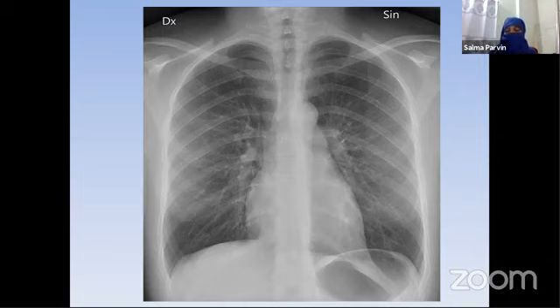But about the hemidiaphragms, I advocate that you should go from the posterior ends of the ribs, because from the lateral view in humans, the height of the posterior convexity of the hemidiaphragms is really nearer to the posterior half of the thoracic cavity rather than the mid or anterior aspect. So it's better to go through the posterior ends.